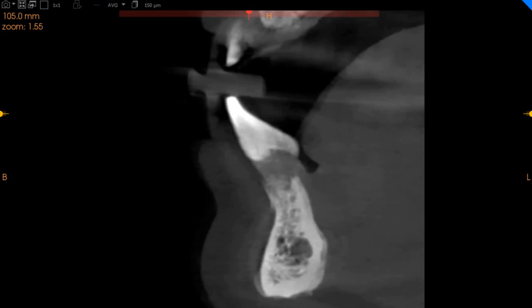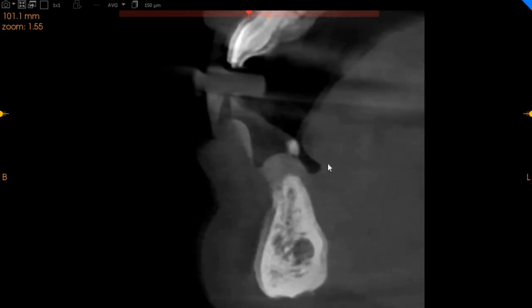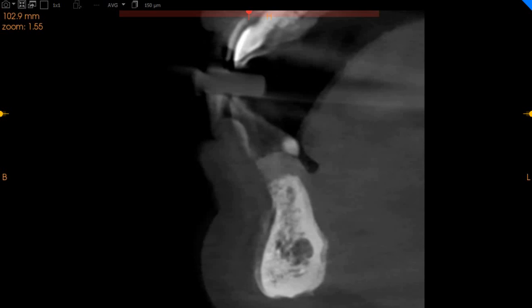Moving to the lower central incisor region, lower left. Here we again don't have any significant bone crestally, but we have approximately 6 millimeters of width with 10 millimeters of height. Slightly better bone quality on the lower left central incisor region.